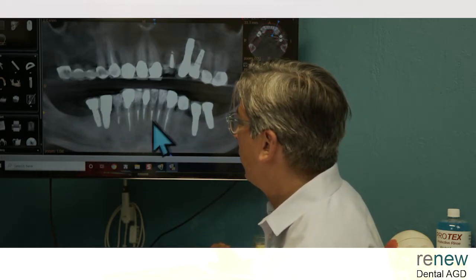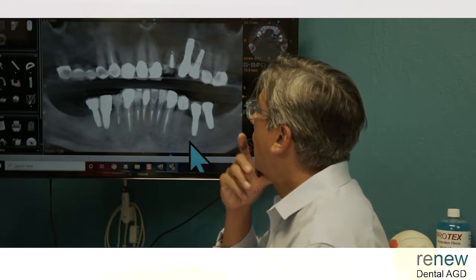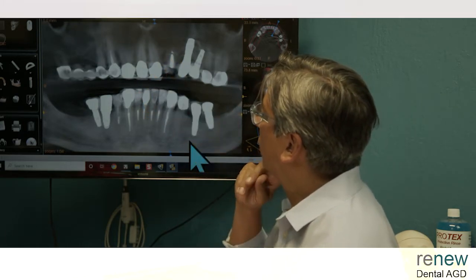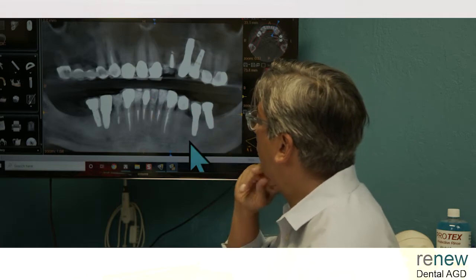Wasn't done here, but we see that this patient's had a lot of dentistry done. Every tooth has had some major work. Crowns, root canals. You would think that she would really hate the dentist here. So one more thing. Now she's got a root canal treated tooth here that ends up cracking and breaking. She has an implant here. She's got a natural tooth here.